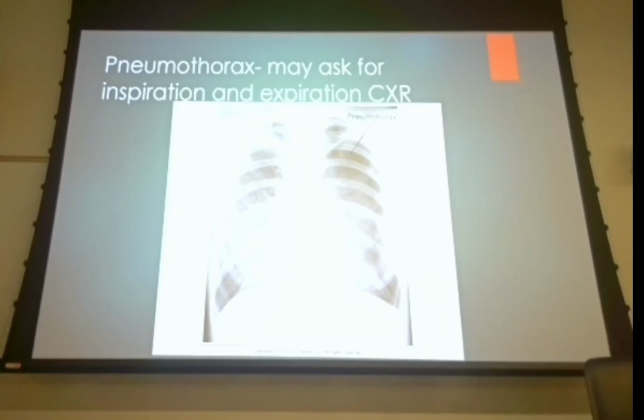So some of your spontaneous pneumothoraces are going to be traumatic. Some of them are not going to be traumatic. And again, your demographic there is typically somebody with a runner's build. Hyposthenic patients, especially males, have a tendency to get a spontaneous pneumothorax. So this is a fairly good sized pneumo here. They probably put a chest tube in for that.